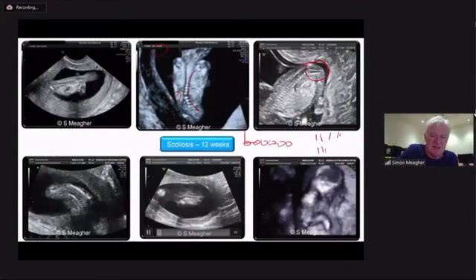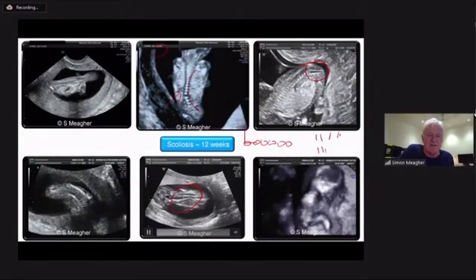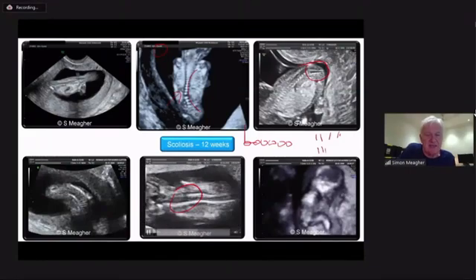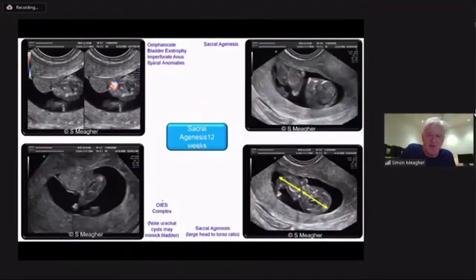Or you may see that there's a tilt in the thoracic spine. Most often, I should say, you see that in the setting of an omphalocele with a thoracic tilt. But if you see it as an isolated finding, consider hemivertebrae. And once you do that, the next step is to move to the limbs and the heart to see whether it's part of VACTERL or VATER.